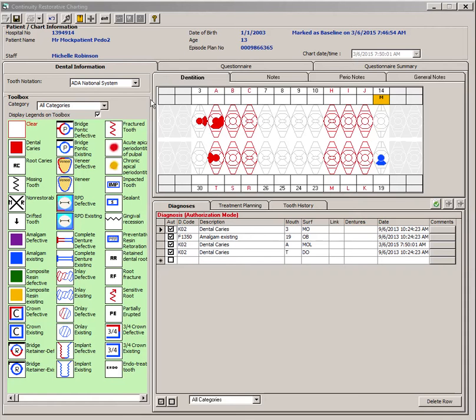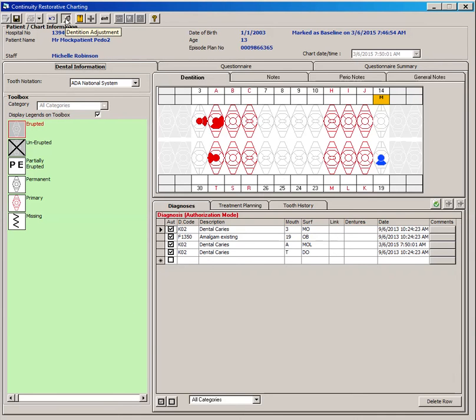this process. The first thing you're going to look at is, does this tooth grid show the teeth that are actually in the patient's mouth? If you need to change the teeth, this patient is 13 years old, the chances of having all of these baby teeth are slim. So we look in the patient's mouth and we need to change the teeth. I will come to this button here, click on it, and it allows me to change the teeth.